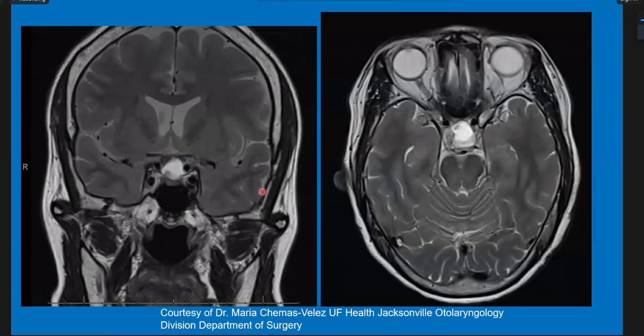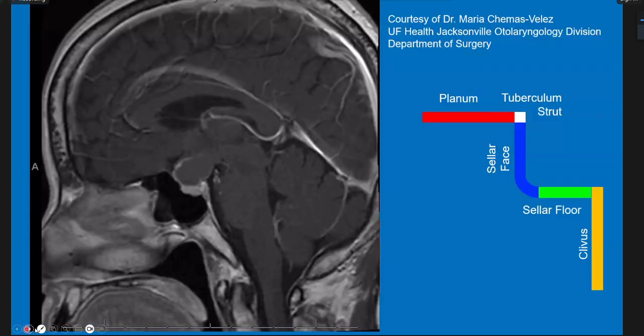So the summary of this case, you have a predominantly solid complex mass, and you can see the pituitary, you have the mass, you have the chiasm that is effaced, partially effaced, and you have the carotid artery flow voids.